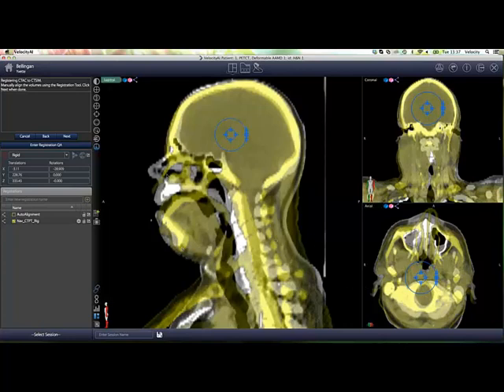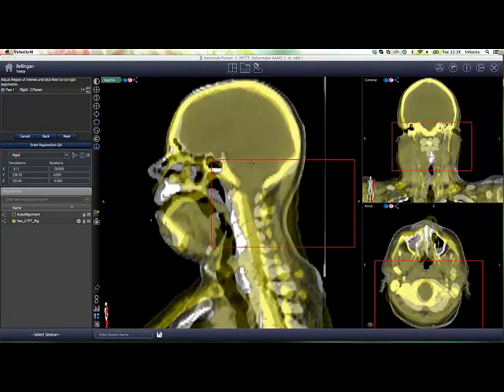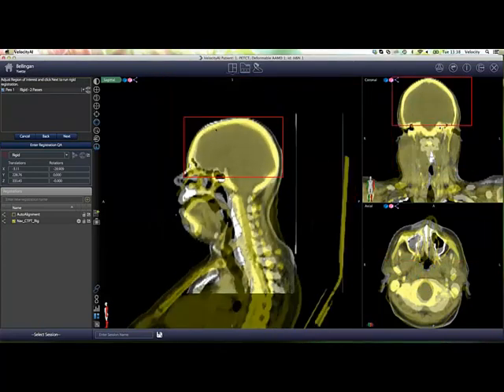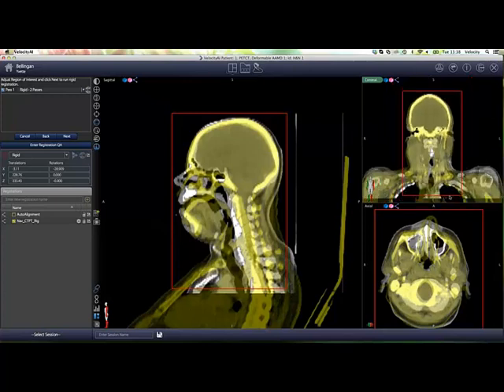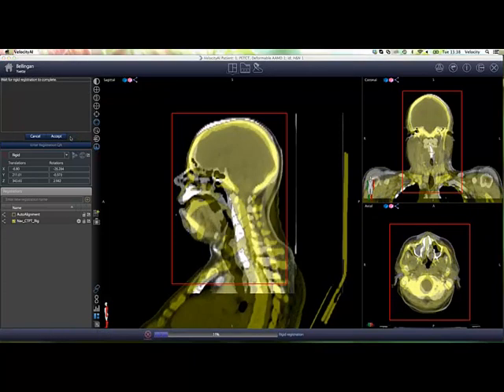So this one, and then we can have a look. The region of interest is dependent on what you want to do. If you're registering 2 images, and as I say, you will have the patient notes in front of you, so you're going to know the areas that are important and what you need to look at. I tend to set my region of interest a little bit bigger as opposed to smaller, because I can always cone down. The algorithm will allow you to continue with the next step of registration if you have completed this.